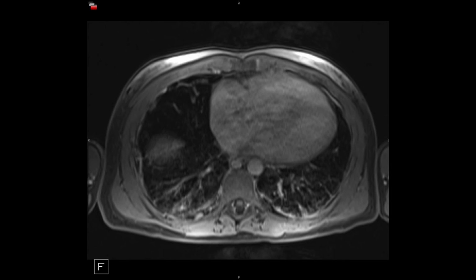You start seeing concave margins and overall, of course, decrease in size. And you want to remember that not all subacute PE is chronic PE, and it's not all chronic thromboembolic pulmonary hypertension. You really want to see that it's persisting over a number of months and that the patient develops pulmonary hypertension.